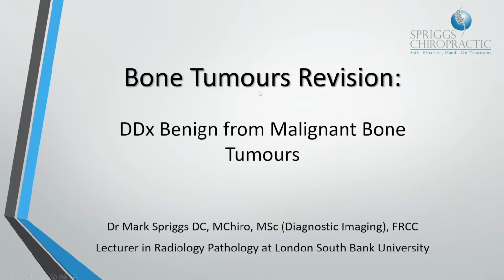Today we are going to be discussing how to differentiate between malignant and benign tumour processes. These are of primary bone lesions in particular, just to clarify that one. So let's get into it.